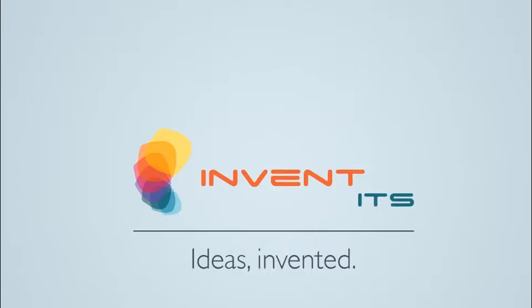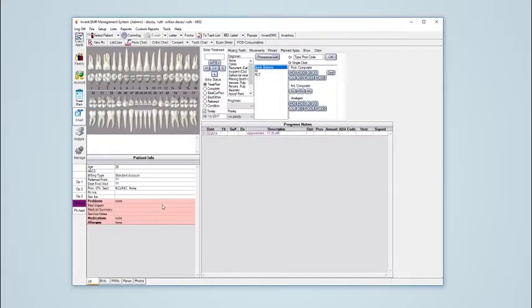Hello everyone, my name is Ali and today we're going to talk about the Perio Chart. The Perio Chart is a very useful and dynamic tool that will help dentists keep track of their periodontal examination readings. To access the Perio Chart, you simply click on the Perio Chart.